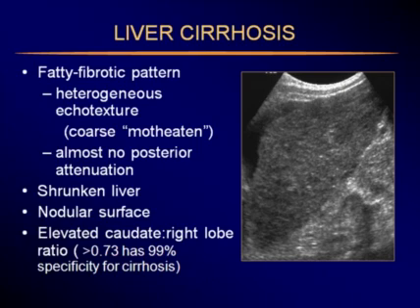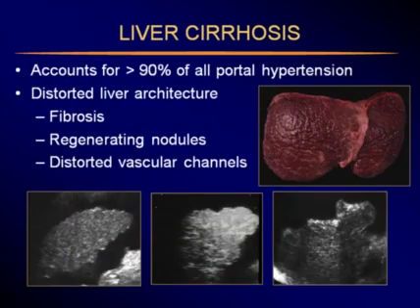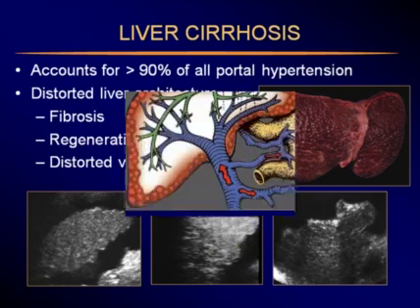It's not sensitive, but it is specific. Here's a cirrhotic liver. Try to imagine what you would see on ultrasound. You see these nodular areas of regeneration all throughout. In between are these fibrotic bands, and that gives this nodular appearance, sometimes micronodular, sometimes the nodules are bigger, and sometimes macronodular appearance. Look at these tiny little islands of regeneration inside the liver, which cause vascular channel disruption, etc.